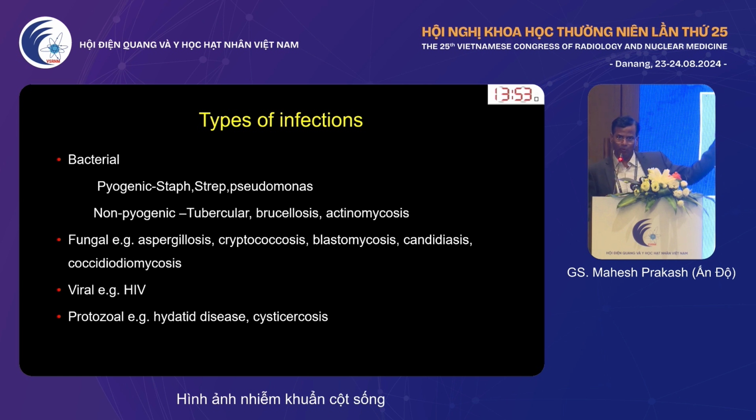Then the whole list is there. Fungal infection can be involved, viral infection can be there, and a lot of protozoal infections can be there. I will show you some examples of each of these infections, to know how they appear on imaging.